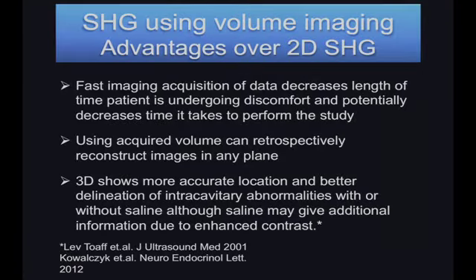So let's just take a look at what the advantages of 3D sonohysterography may be over 2D sonohysterography. First, fast imaging acquisition of data would decrease the length of time the patient is undergoing discomfort, and potentially decreases the time it takes to perform the study. And using the acquired volume can retrospectively help us to reconstruct images in any plane.